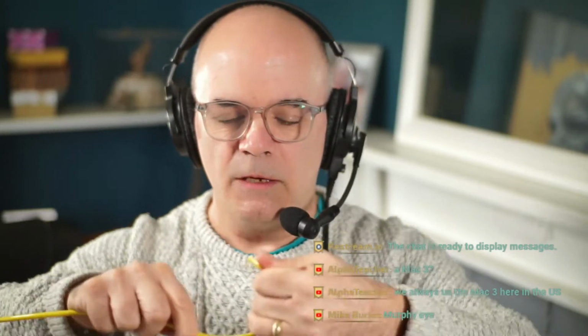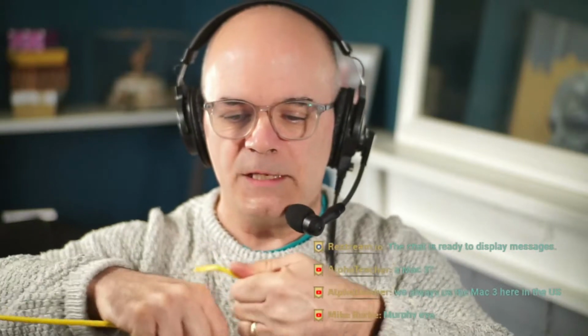Some of the ones we've got at work at the moment I think are a bit cheap and are quite hard to bend and keep in shape. But this one, if you bend it reasonably firmly, you'll often see the intubator doing that because they want to bend it so that it can get round the corner and find those vocal cords.